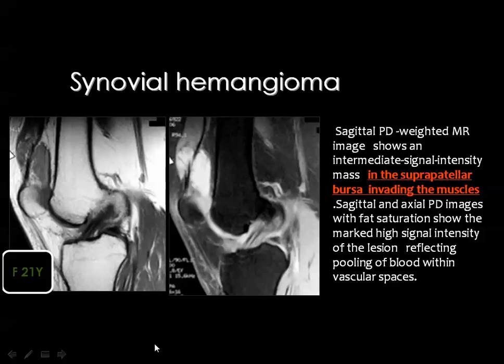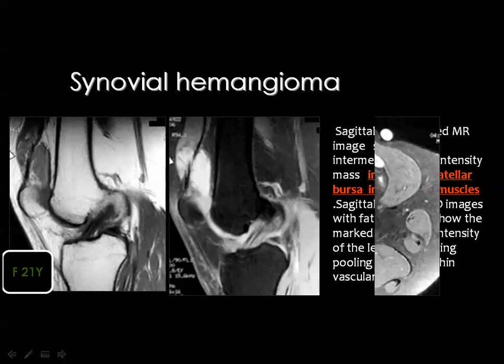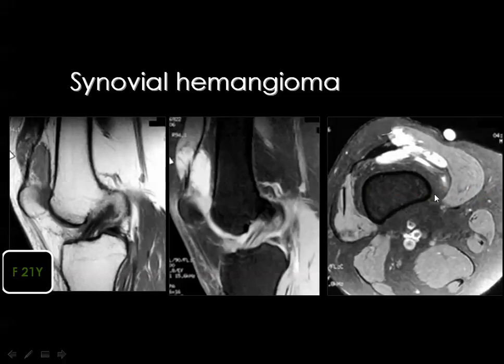You remember that hemangioma is usually of a very bright signal in the T2 weighted image. Hemangioma is usually a creeping lesion that can spread within the joint. It will show intense post-contrast enhancement with evident high signal in the T2 weighted images. Also, here you can see this is the hemangioma, which has a creeping nature between the muscle and the joint.